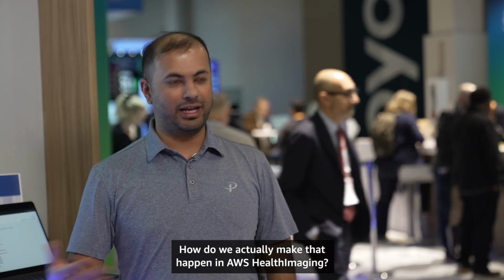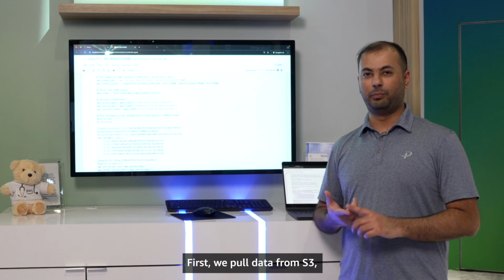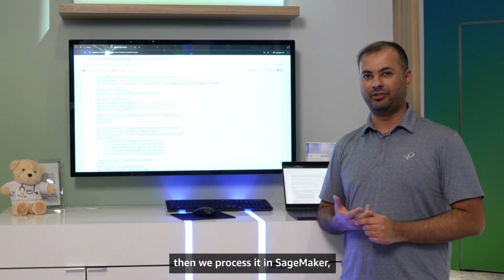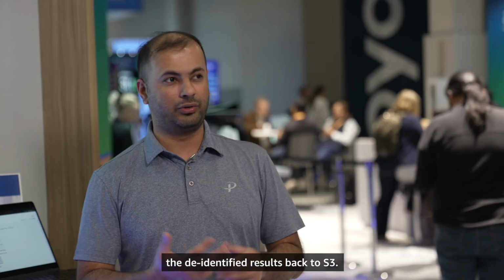I'm Hasham from Johnson Labs, and now we'll be going over the implementation part. How do we actually make that happen in AWS HealthImaging? So there are 3 steps. First, we pull data from S3, then we process it in SageMaker, and then we push the data back, the de-identified results, back to S3.